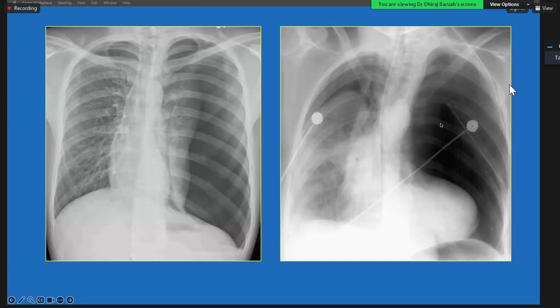But here in this collapsed lung, you see it is not going towards the hilum. It is falling along the diaphragm. Even with the chest tube, this pneumothorax is still big. So when the lung falls down along the hemidiaphragm, and you also have a chest tube where the pneumothorax is not decreasing, you will have to worry about bronchial injury, tracheobronchial injury.